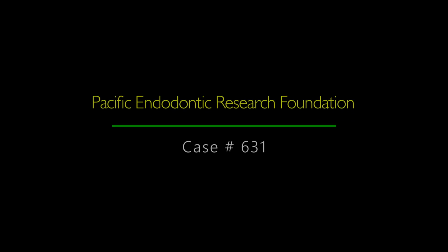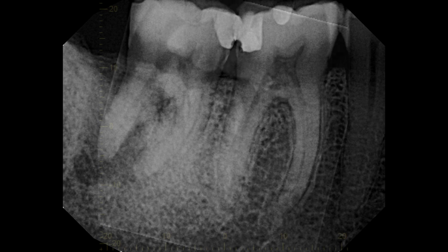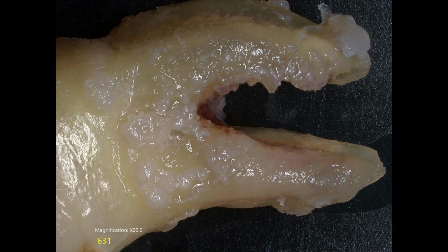This is a preliminary report on Reid's case number 631. It's a very interesting case. I do not know what was done here. This is the preoperative x-rays and cone beams, large area. This is how I got the tooth in formalin.